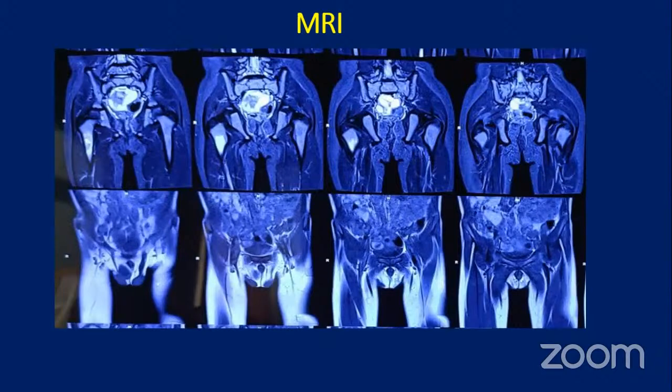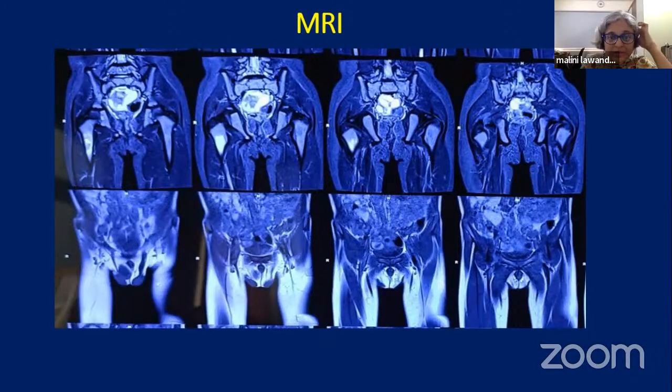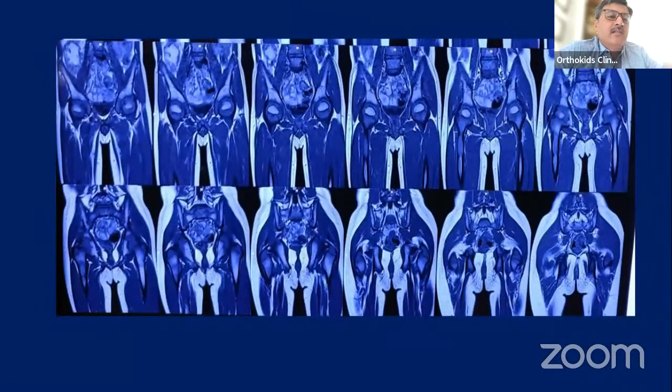This is an MRI. Do you have the axial images also? Yeah, show further images if you have. Move ahead.